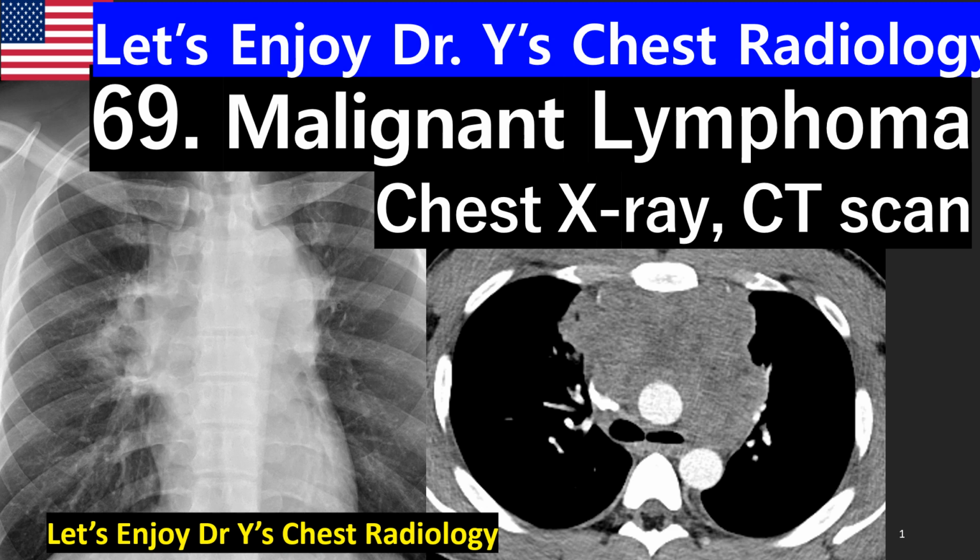Chapter 69. Today we're gonna talk about the malignant lymphoma findings, chest X-ray and CAT scan findings of malignant lymphoma of the thorax. Let's go.